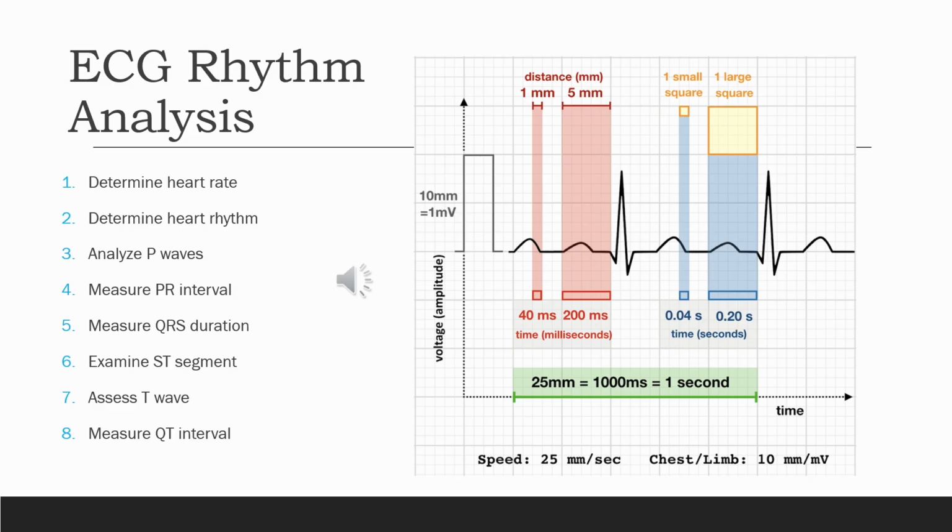Now, if we have an irregular rhythm, or maybe even regularly irregular, then this is when we have R intervals that are occurring at different time intervals. So instead of having that same consistent amount of time between each R to R interval, they can vary. Some are going to be really short between one R to R, and then between the next R to R interval, it may be even longer. Again, it's just an irregular heart rate.